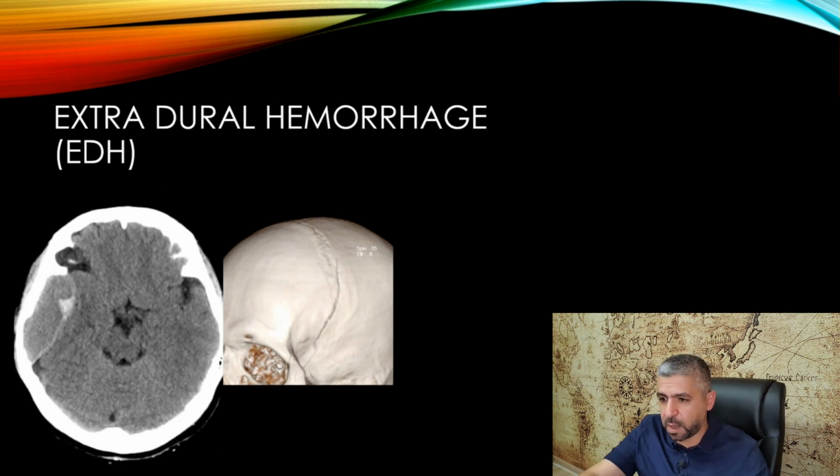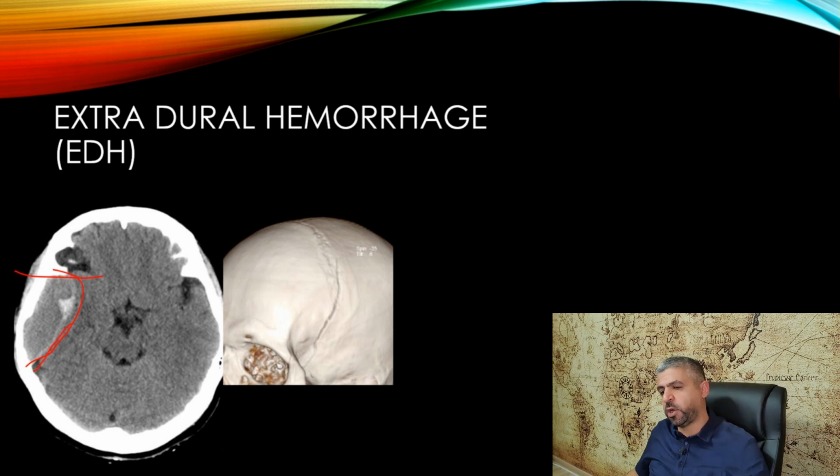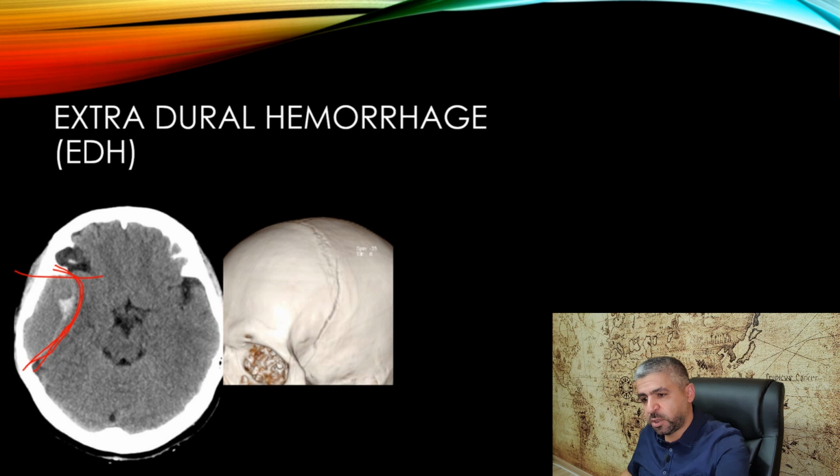What about this one? This is an epidural hematoma here, and it's limited by the coronal suture here, and here it's not reaching the lambdoid, but anyway, it's limited by the suture. However, if you look at the density, it's relatively hypodense compared to the previous one. And why is that? Because this is a more chronic hematoma. When time passes, blood will clot, will be replaced by serum or plasma, and that's why you will have decreased density of the epidural hematoma.